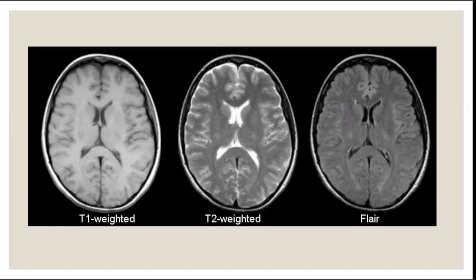So this is how the three of them would look different. In a T1 image, you can see mainly the brain tissue, which is hyperintense. In T2, you can see the water as hyperintense. In FLAIR, somehow everything is attenuated. You can't see water, and in the ventricular system, anything that is a region filled with water, you will see something inside it.